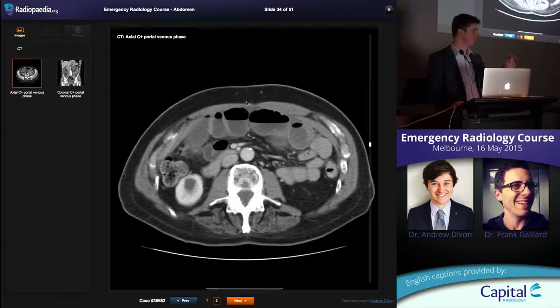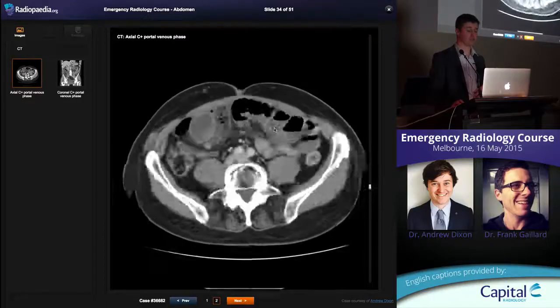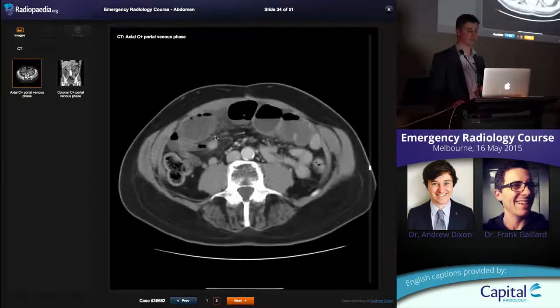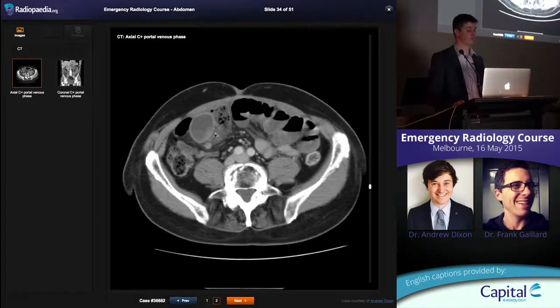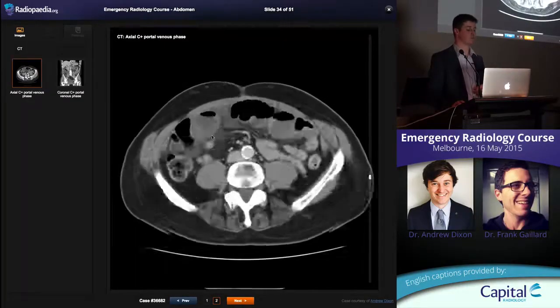So feces within the small bowel always develops at the point of obstruction or just before the obstruction, okay? So if we're looking through all these bowel loops, we're seeing that most of them have just got nice simple air fluid levels in them, and as we come down here, we notice little locules of gas sitting in there. That's fecalization of the small bowel content. So it looks like feces in the large bowel here. That's where your obstruction is going to be.